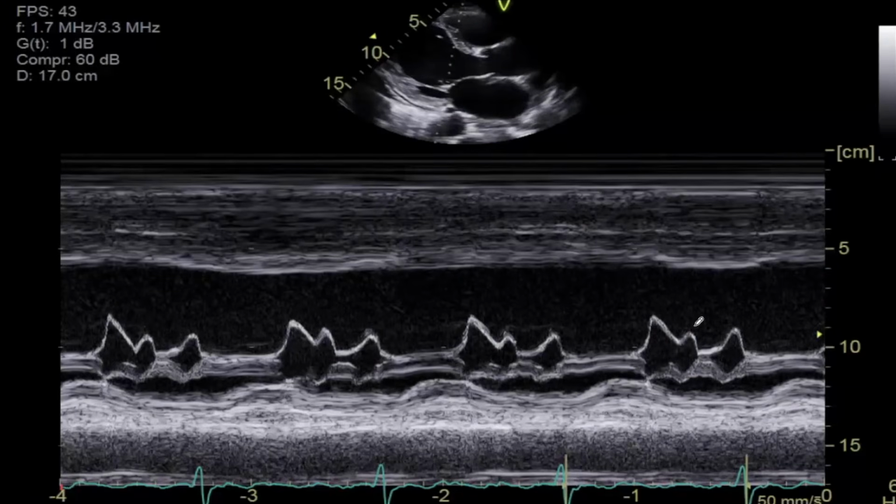So what do we have? We are supposed to have E and A. So if there is something extra, yeah, it could be an extra A. This patient has 2-to-1 AV block.